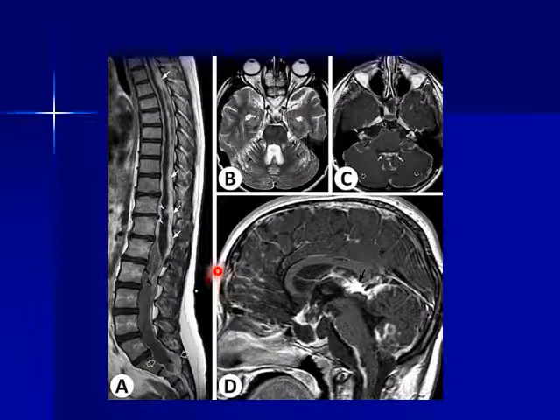It simulates as if you are dealing with leptomeningeal deposits or seeding deposits, masses and enhancing tissues along the leptomeninges of the spine, within the thecal sac, along the leptomeningeal surface of the brainstem, hypothalamus, pineal region, and intraventricular along the cranial nerves.